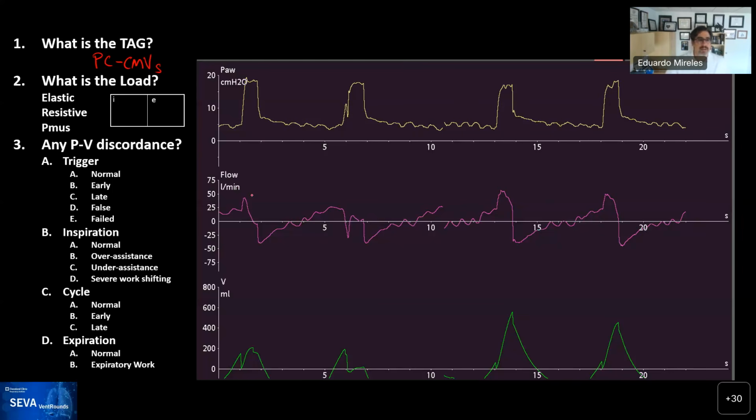And by looking at the exponential decay, you can see the time constant. If it's prolonged, it takes a long period of time. And if it is short and it returns to baseline rapidly, then it's a short time constant.